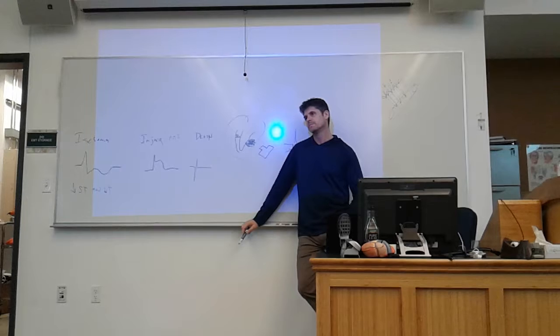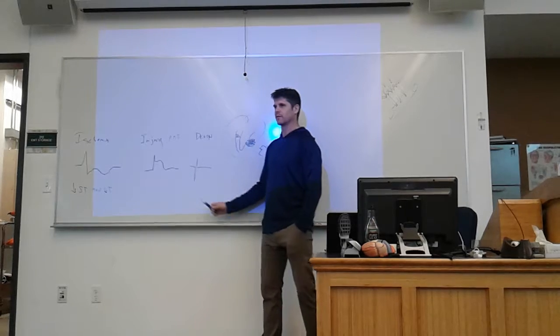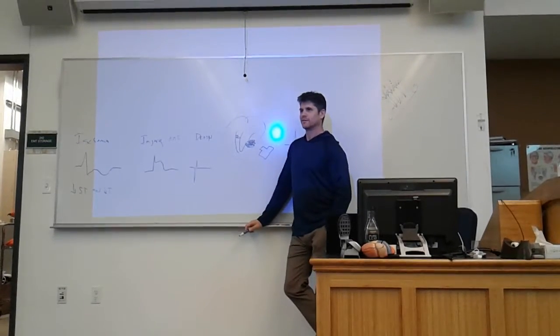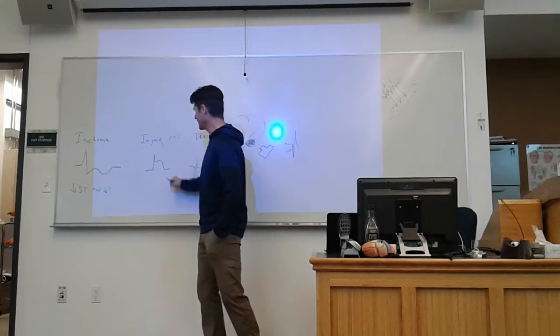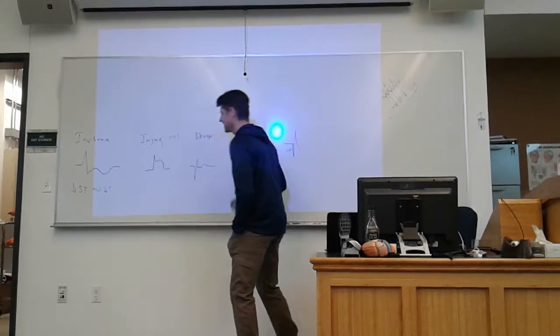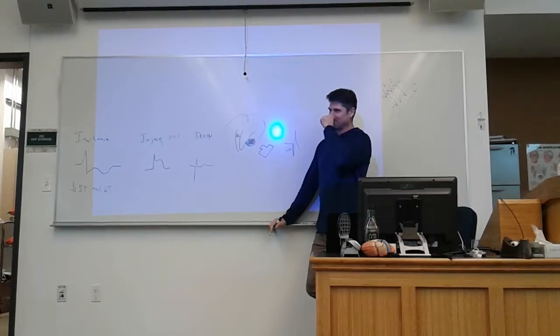Why aren't you seeing a P wave of the living tissue on the other side? Well, P waves come before, sorry, Q waves, T wave. Well, you will. I just didn't draw it. You will. I only drew the QS complexes here. In the end, I could finish this out. Is that helpful?